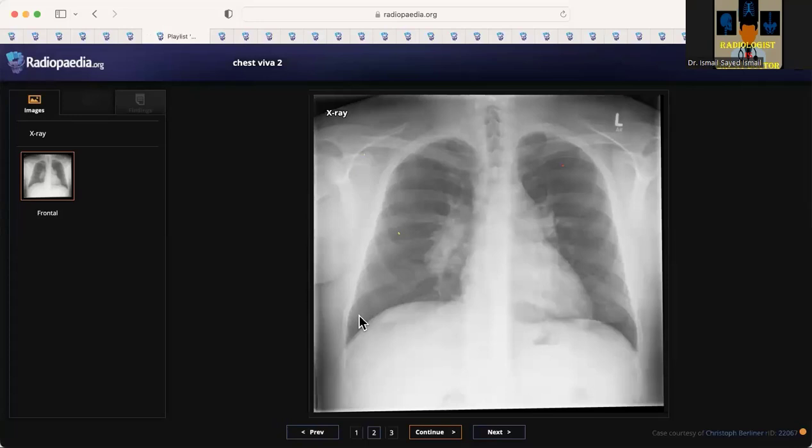Okay. Yeah. So this is the chest radiograph of an adult male patient. I can see that the hilum bilaterally is appearing bulky, especially the right hilum, which is showing that lumpy, bumpy pattern. And the aortopulmonary window is appearing convex, and it is appearing effaced. And looking at the lungs for any parenchymal fibrotic changes, which I cannot appreciate much.